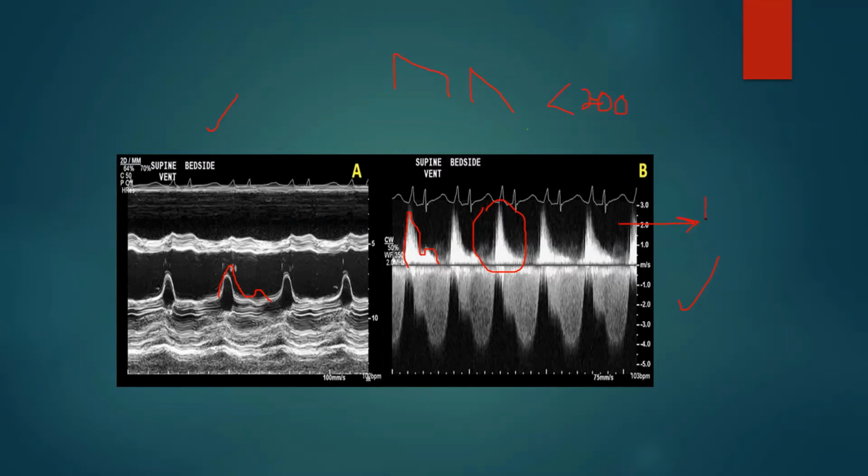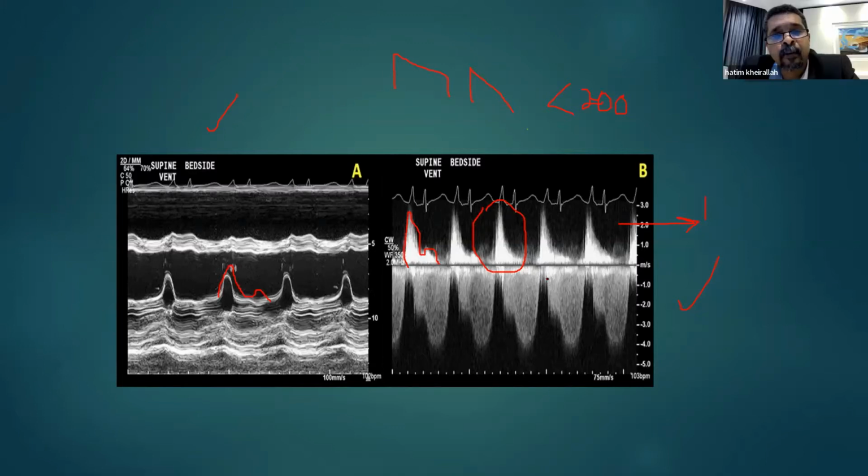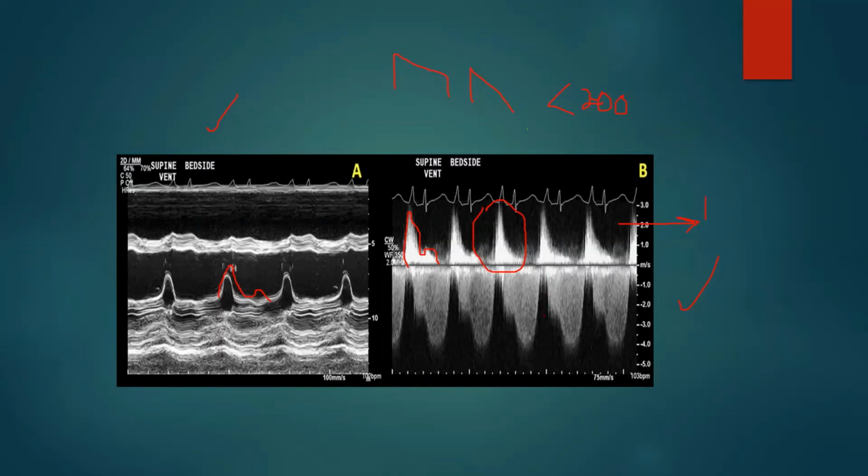Diastolic dysfunction. Diastolic dysfunction of grade 3-4, exactly. And yes, even there is MR. Sorry? MR. What's the problem with the MR? It means there is also a high LVEDP. The MR itself? Or something special in this MR jet? Look at this MR jet. Yes, thank you so much.